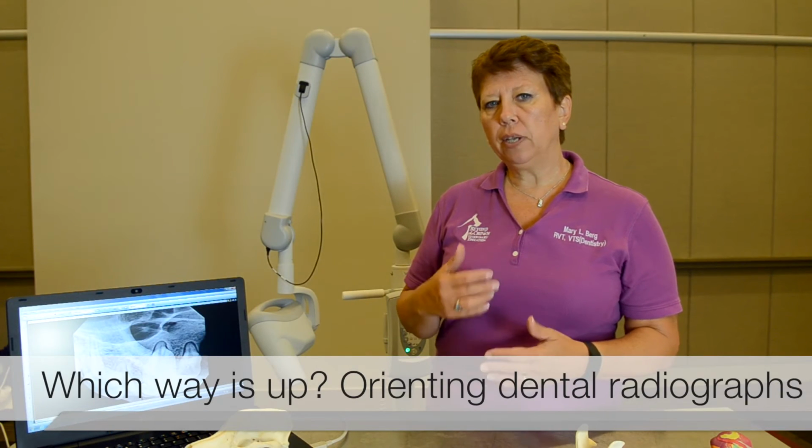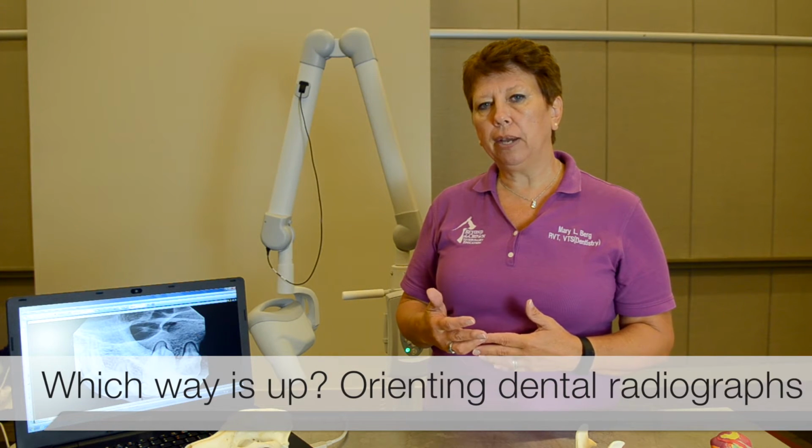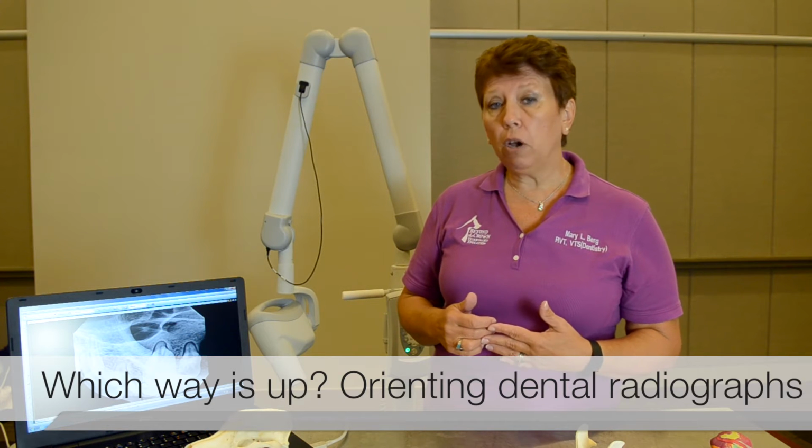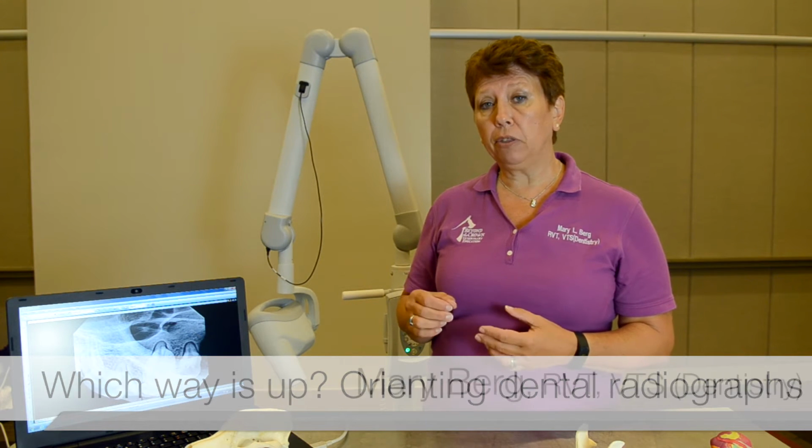I want to go ahead and talk about how we orient the x-rays to know exactly what teeth I'm actually looking at. In many of our software programs, we can select the correct teeth when we take the x-ray, and it will give the number of that tooth.